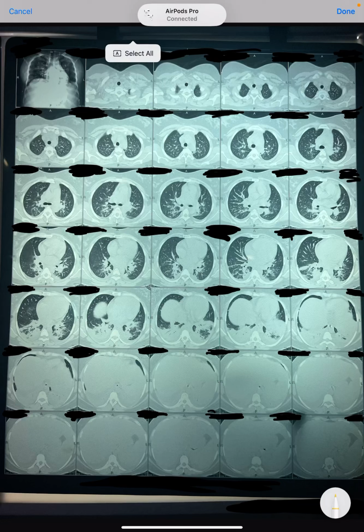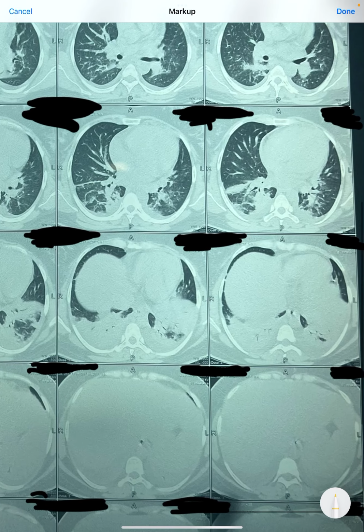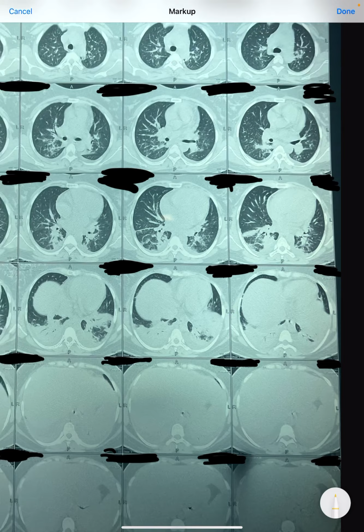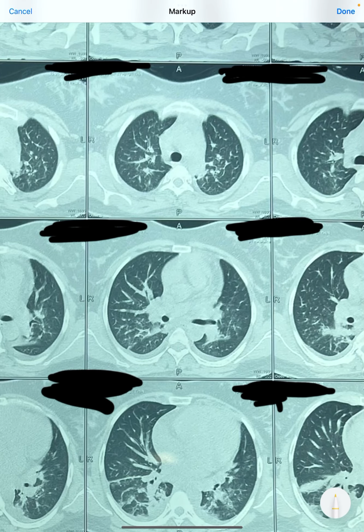Now, this is a very interesting HRCT of the chest where we can tell very nice findings. When we zoom in, I want to highlight two things. Whenever we want to trace the lungs, we have to trace the lung like this. This is all lung border, and that is all concave. You can see this is all left-sided lung, and this is all right-sided lung.